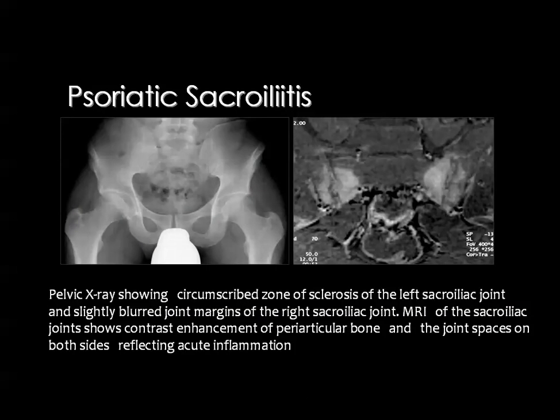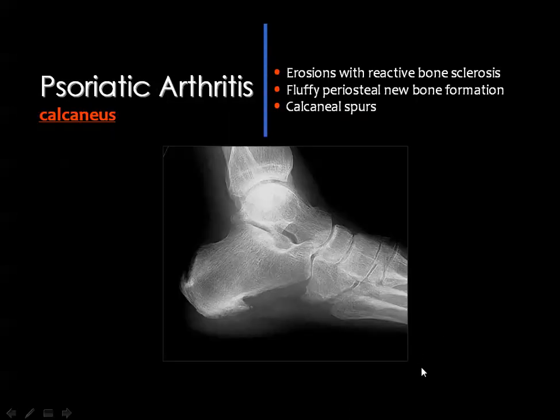You remember in cases of ankylosing spondylitis, early in the disease, you get bone marrow edema, which is better seen by MRI in the opposing surfaces of the sacroiliac joint bilaterally. This bone marrow edema will appear bright in the T2 weighted images as well as in the STIR images. You cannot see these changes in the plain X-ray, of course.